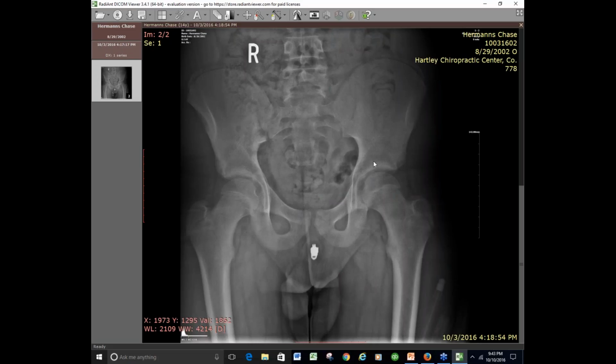I want to make him a little closer. And if we do that same tool, it went to 8. And you're like, wait a second, 8 plus 6 isn't, what was the last number I had? 17? 8 plus 6 is only 14.